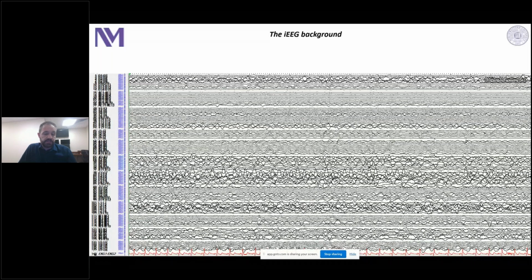So what was that? Could this have been a seizure? I mean, it met some of the criteria for a seizure. It had an abrupt onset, and there was rhythmicity, focal rhythmicity developing in some of the channels.